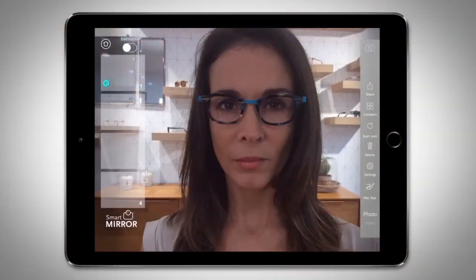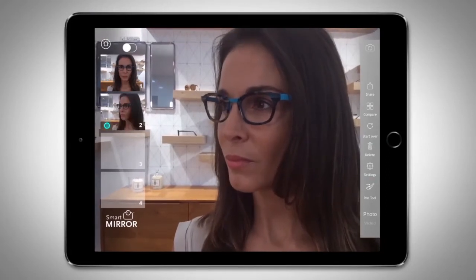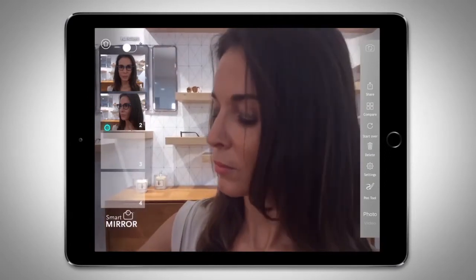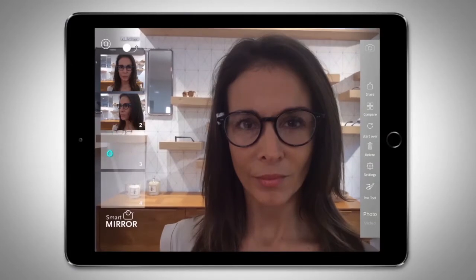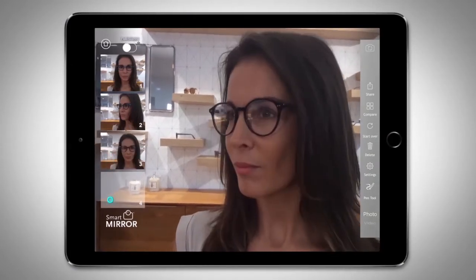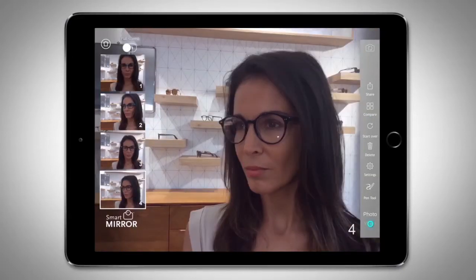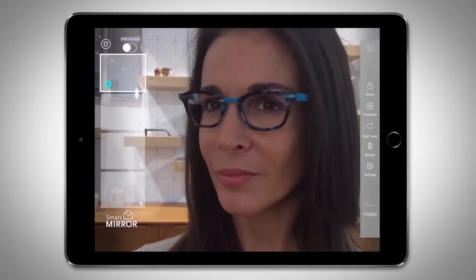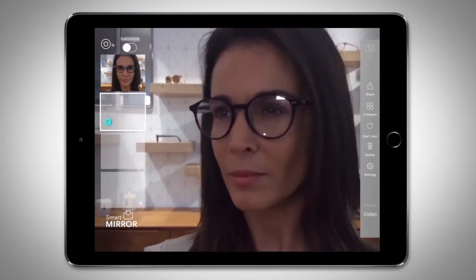Take pictures of the frame by pressing the numbered boxes on the left frame. A picture will appear in each as you take it. Ask your client to try on the next frame. Take a picture with a 3/4 angle to show the frame and face features, especially logos on the temples or the end piece. Use the slide to switch from photo to video, because video can be better since a woman or man may want to see what frames look like from a variety of angles or the customer's whole self.